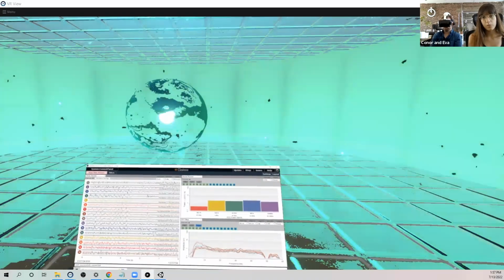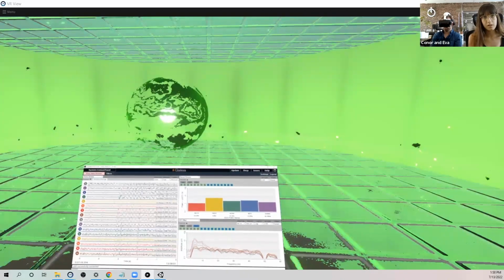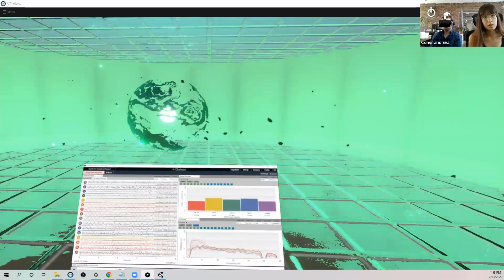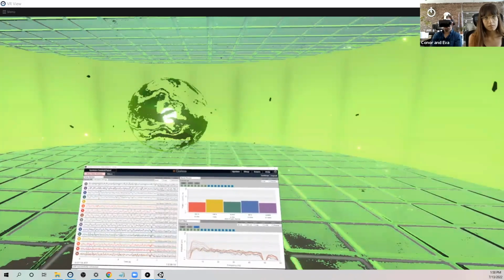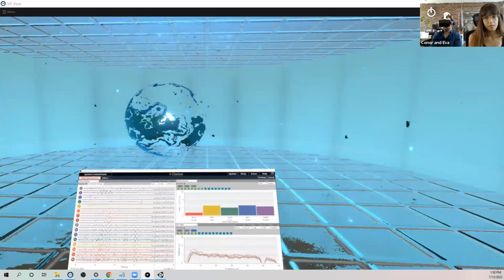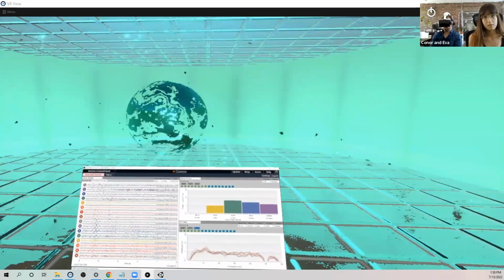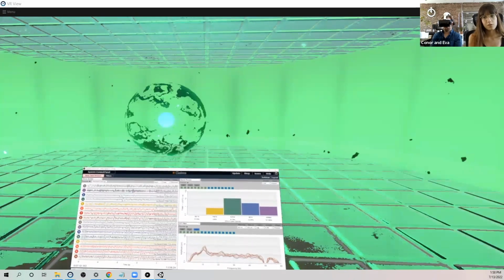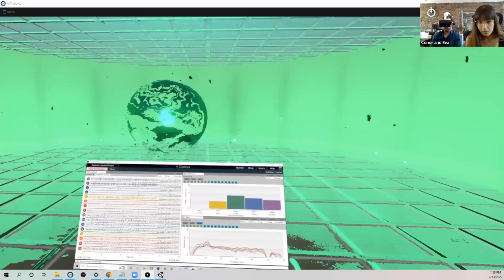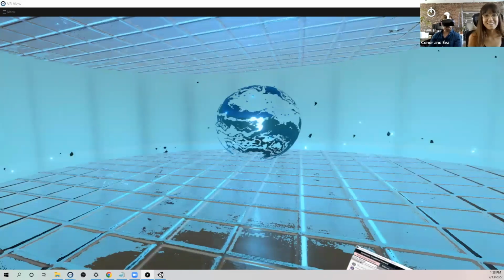And now I'll stop. And while he was doing that, you could see the room going yellow, which is the color we've mapped to that power band. So right now it looks yellow, a little bit green. Now I'll chill. Back to green. Yeah. Now back to alpha. Looks green. That's some strong alpha. And now out. Cool. Should we try and fire up Galea cart?